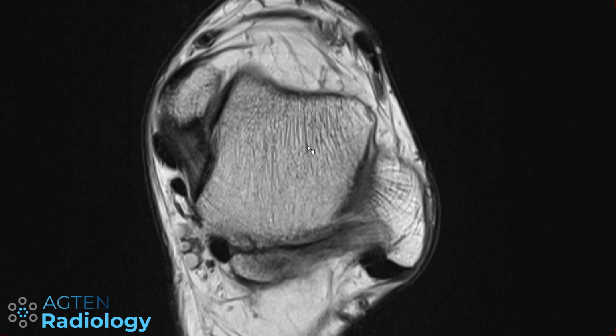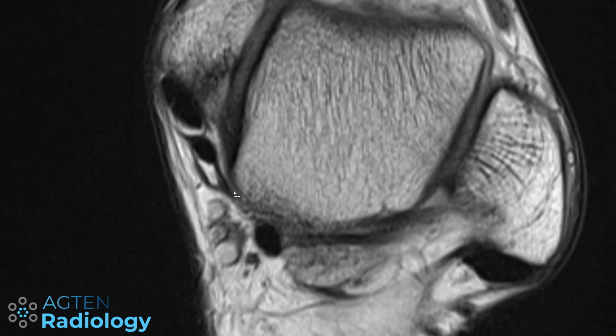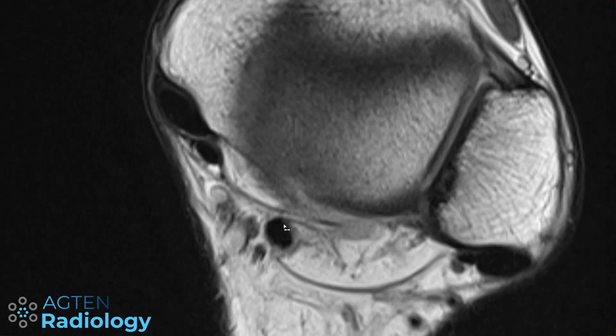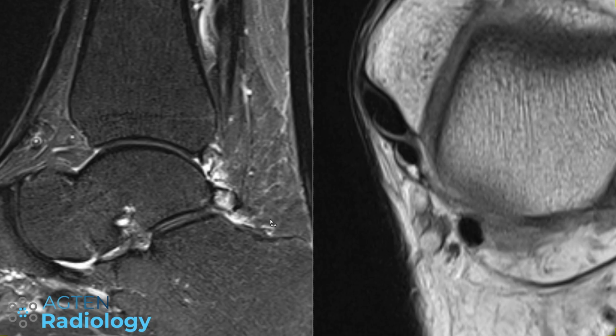And if you look here on the transverse section now closely, you can see the medial tubercle, and this is the lateral tubercle, which is then not fused, forming here this os trigonum. And in between, in this groove, is the flexor hallucis longus tendon. And you can now also understand why you can get problems with the FHL tendon. So if you have the tendon sheath here, it might get impinged or maybe scarred with this kind of structures here, because it's really running through the posterior aspect of the ankle joint.